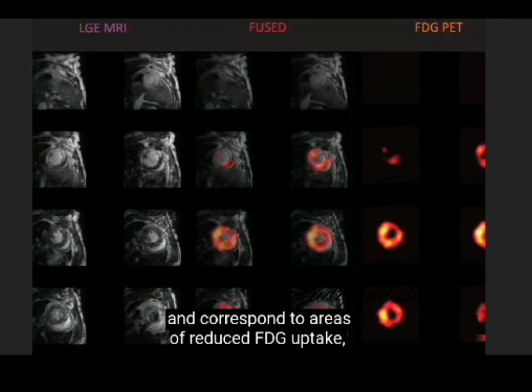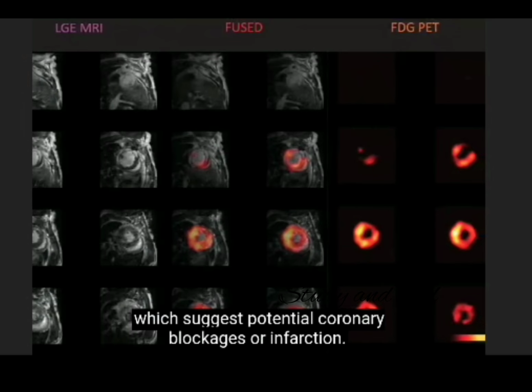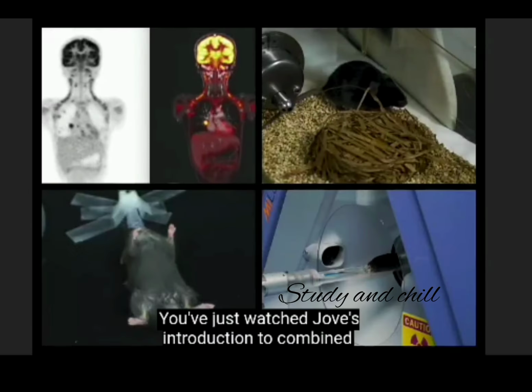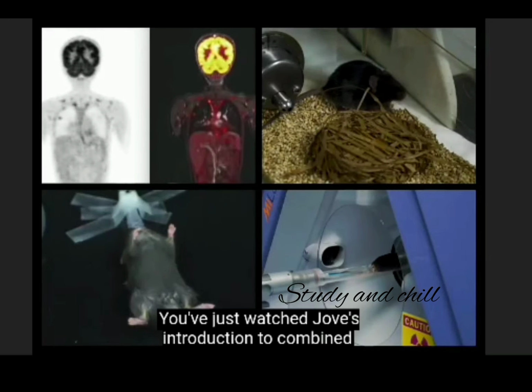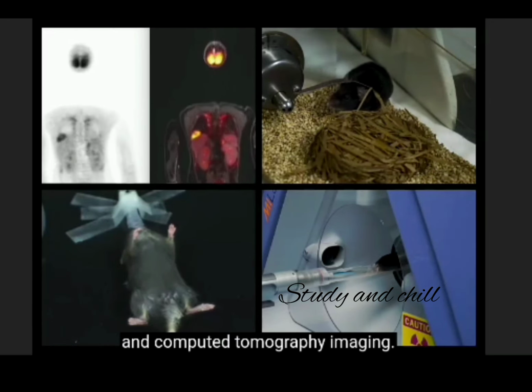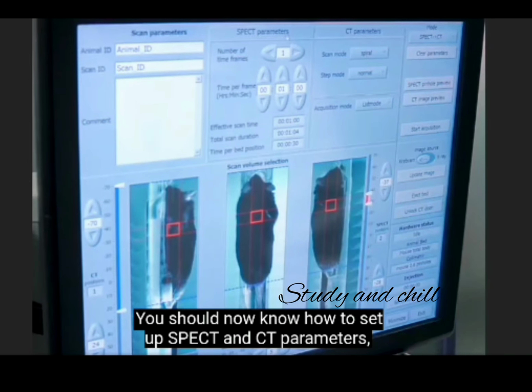You've just watched JoVE's introduction to combined single-photon emission computed tomography and computed tomography imaging. You should now know how to set up SPECT and CT parameters, perform the combined scan, and analyze the image. You should also know how nuclear imaging is used in biomedical applications.